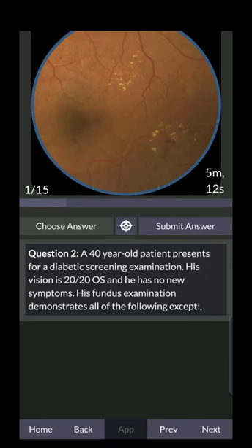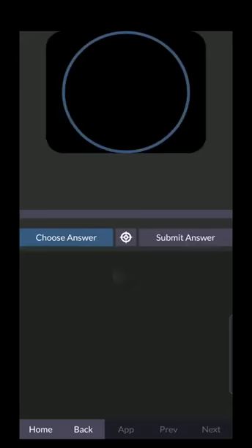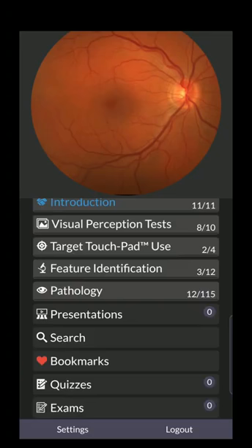And they're all randomized with respect to their images as well, so you'll never get the same quiz twice. If you exit and re-enter, you'll get a different quiz. You may get the same question, it'll be in a different order, but you'll get a different image associated with that question. Comprehensive quizzes, a little bit more for higher end learners. Again, more geared towards the person with a higher skill level. You see, exams has a 0 beside it. That means that there are no exams for me to take as a student defined within my class.